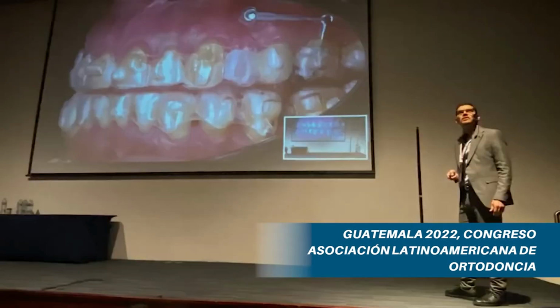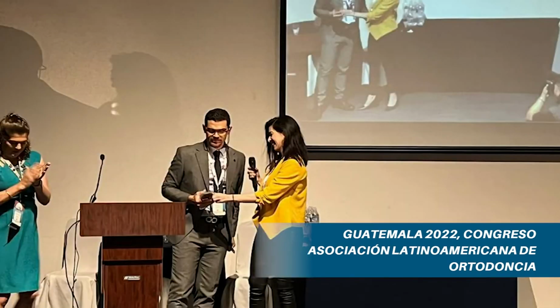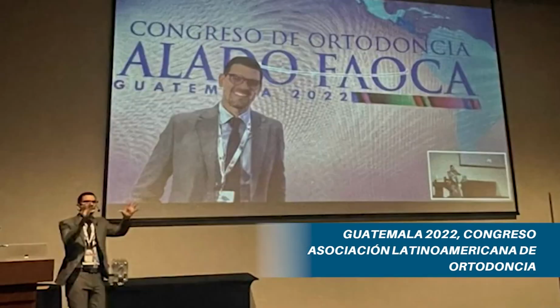Step 2. Evaluate the displacement of the upper molars. It is necessary to expand the first molar. Try mesial out rotation first and then expand the molar.